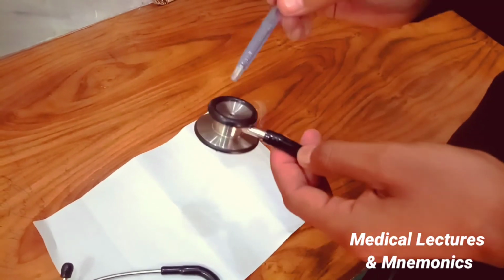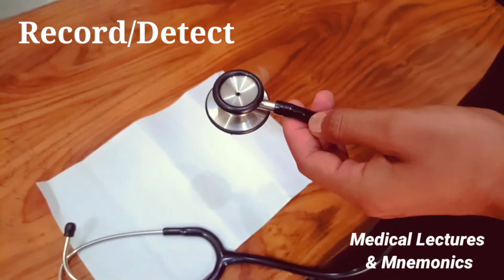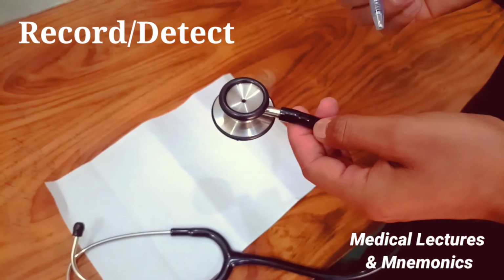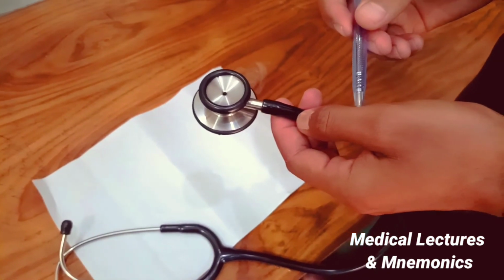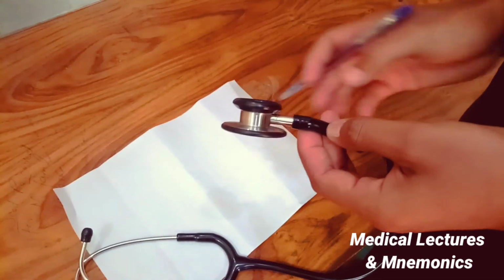So the function of the stethoscope is to record the sounds that are produced in the body organs, mainly in the heart, lungs, and the blood vessels, produced as a result of blood flow. So this was all about the stethoscope.